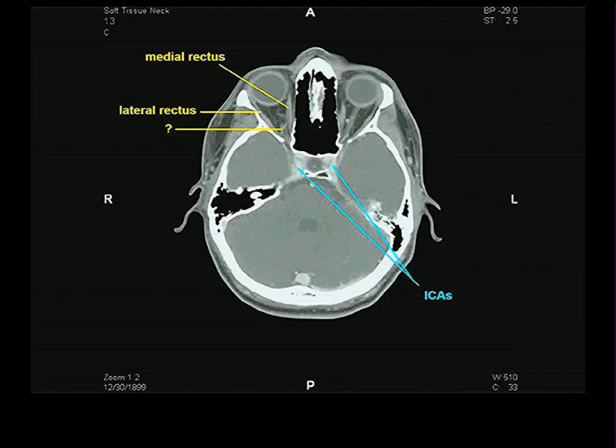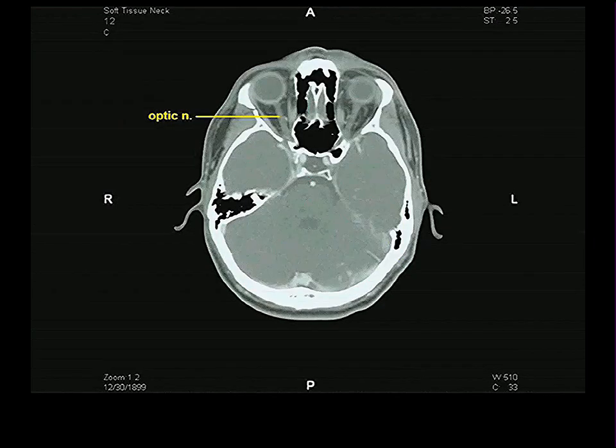It's a variation. That's right. Good. Very good. In about 25% of people, the ophthalmic artery crosses inferior to the optic nerve. It is always the thing which is running from lateral to medial in a fairly sharp course, whether it's inferior or superior to the optic nerve. Very good answer. Here's the optic nerve.